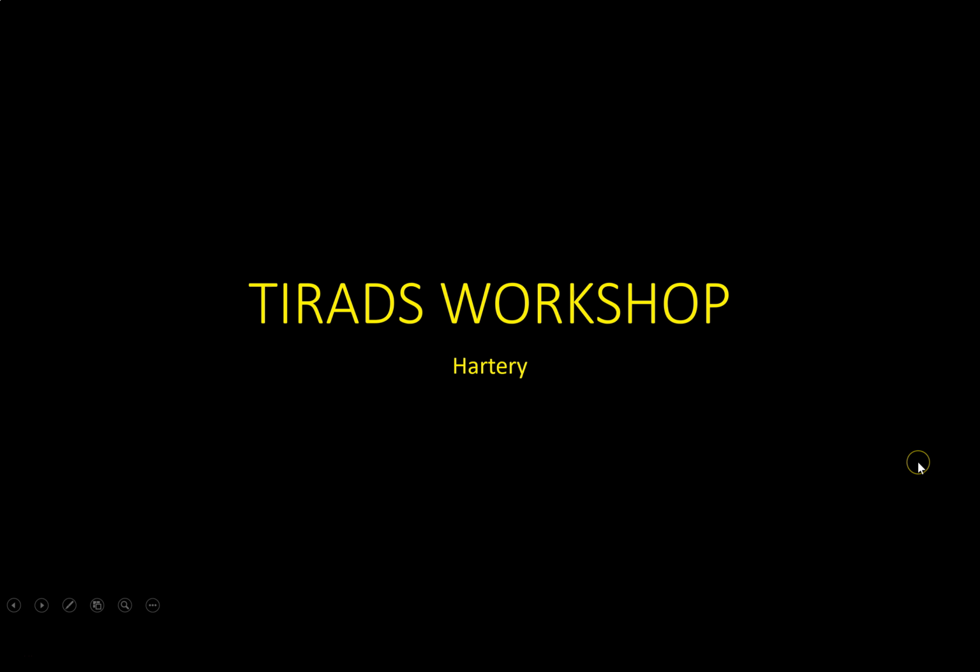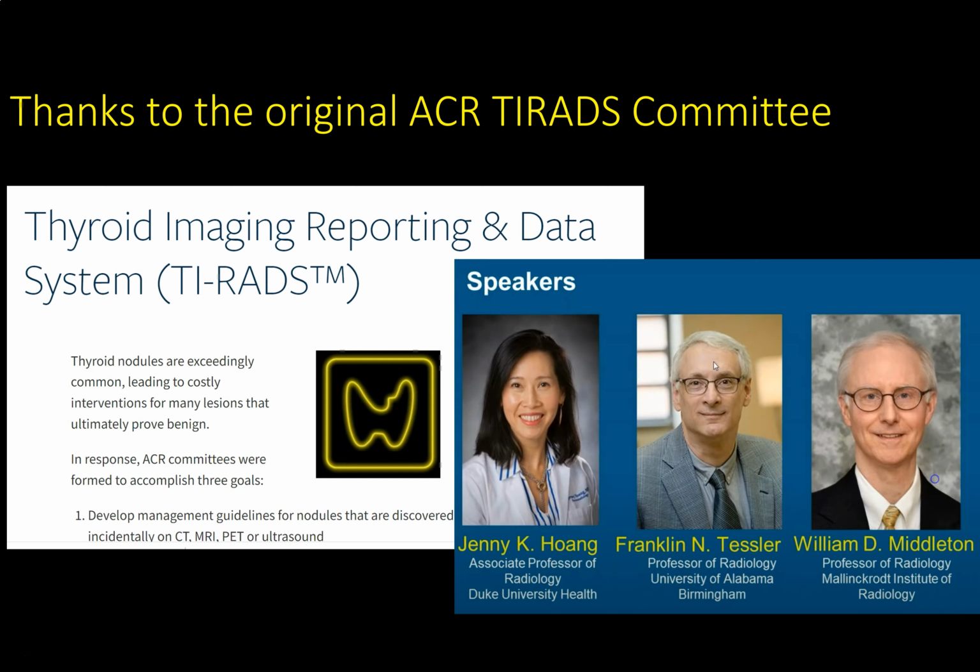Hi everyone, welcome to today's TIRADS workshop. We're going to go over some of the features of TIRADS and then we're going to try to work through a number of nodules to apply these characteristics and get used to the lexicon.